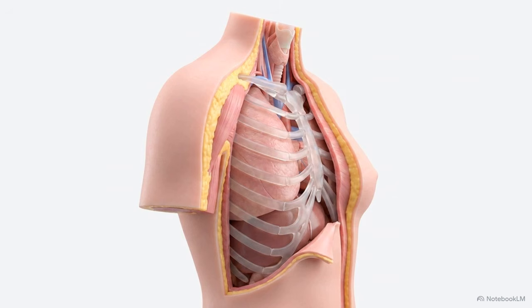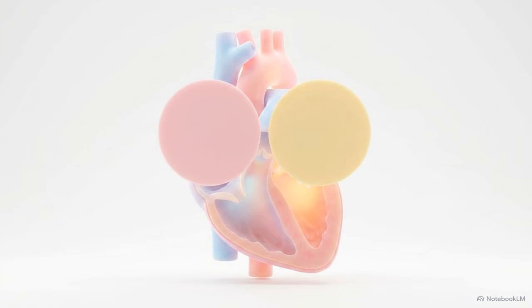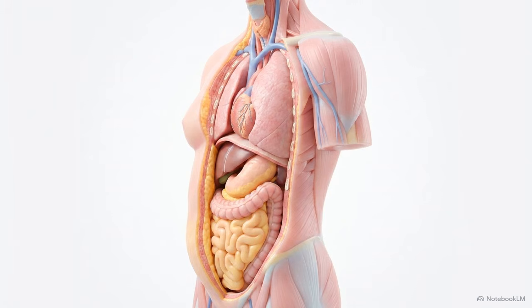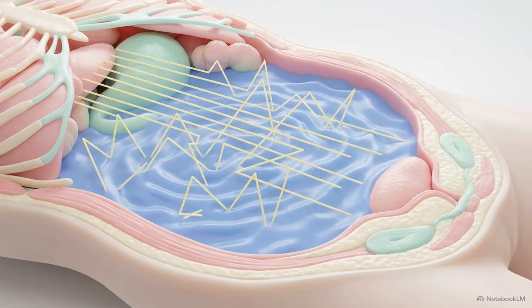External metal isn't the only barrier. Dense soft tissue acts as a strong attenuator. Breast tissue, and particularly breast prostheses, frequently cast shadows that mask underlying thoracic structures. Below the thorax, diaphragmatic attenuation is a primary cause of apparent functional defects in the inferior walls of the heart. This severe attenuation at the diaphragm correlates heavily with obese patients, patients with ascites, and those actively on dialysis, where excess tissue or fluid scatters the signal.